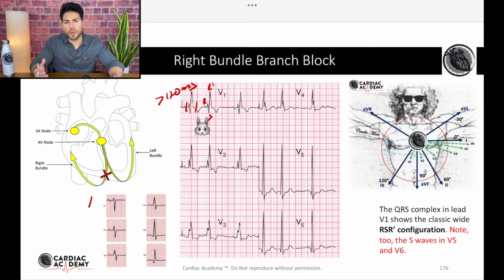So in the right bundle branch block, you're gonna see it starts positive. You can see how this wave is mostly positive, okay? And that's another good way of remembering right bundle branch blocks, is that right bundles are upright, okay? Right bundles are upright. You're gonna see a positive deflection on right bundle branch blocks, okay? All right, and then we can also see that deep S wave and wide S wave on V6, okay, good.